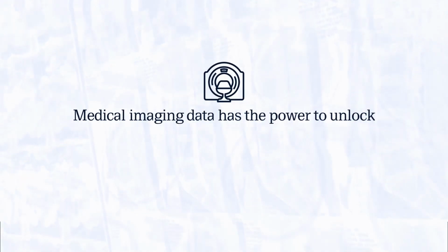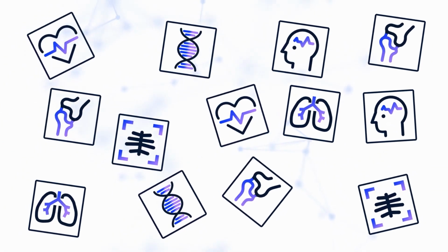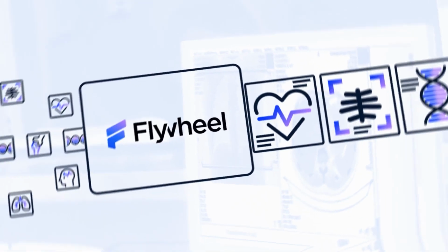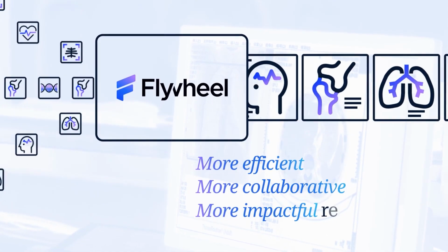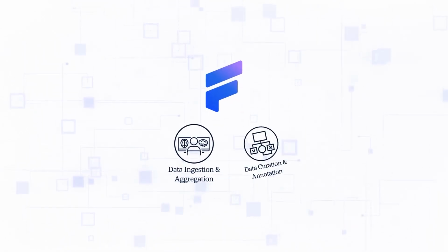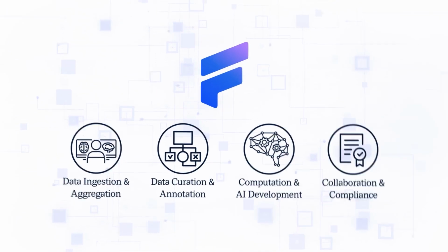Medical imaging data has the power to unlock new innovations in clinical research. But ingesting diverse real-world data from multiple sources, processing that data, and maintaining compliance can consume your time and valuable resources. Flywheel streamlines medical imaging management for more efficient, more collaborative, and more impactful research. It's the only comprehensive platform that accelerates imaging data aggregation, curation, management, and analysis, computation and AI development, collaboration, and compliance.